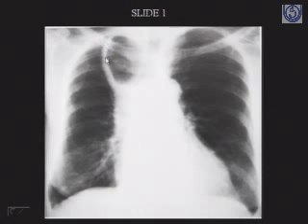what could this be? This could be the air-filled lumen of the dilated esophagus. Yes, all right. So what else would you like now? You could give an assumption that this could be an esophageal pathology, most likely, causing widening of the mediastinum, the esophagus appearing dilated and thus resulting in widening of the mediastinum.